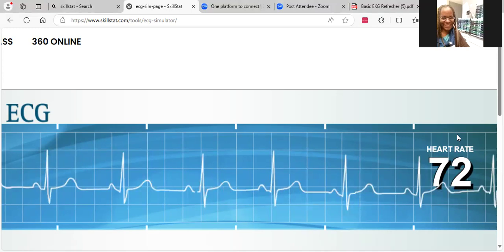And the great thing about working in the cardiovascular telemetry department is the heart rate will typically be on the screen. It is always good to know how to measure the heart rate because at times it won't capture it and you'll have to use your heart chart or count your complexes and multiply by 10 and a 6-second strip.